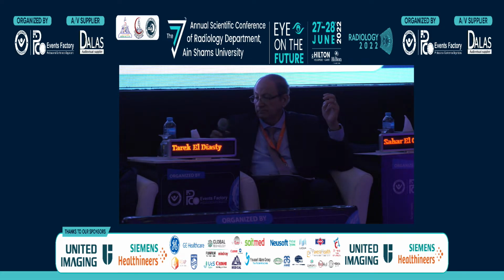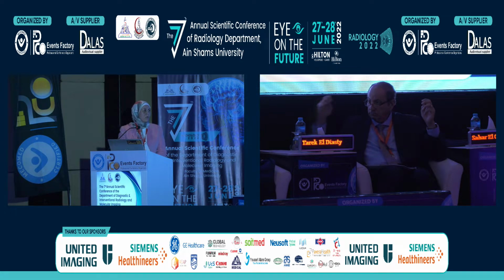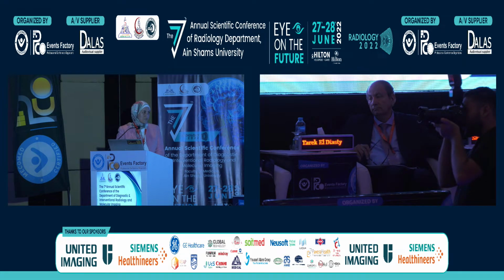Actually, we are still building our experience in the VIRADS scoring. So we perform the whole imaging, including T2, diffusion, and the dynamic study. But sometimes the lesions are very classic on T2 and diffusion alone, and there is no need for contrast injection. But because we can't follow every case during imaging and decide immediately which patient needs contrast and which patient doesn't, we do the whole multiparametric study, including contrast injection.